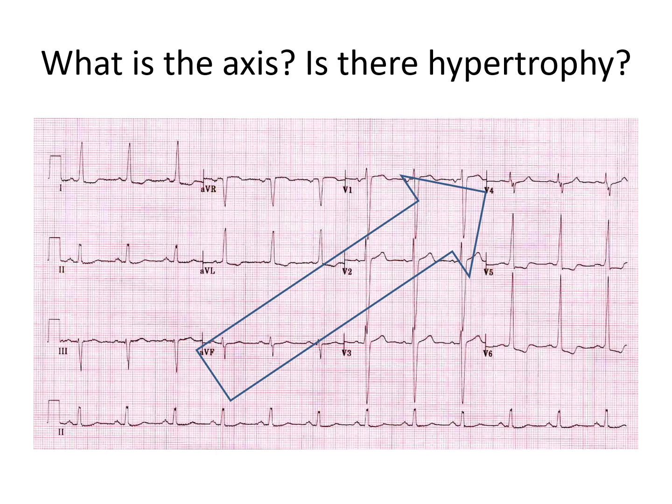Now, let's figure it out just from first principles if there is increased muscle mass on the left. So if there is, we would expect the leads that looked leftwards and upwards and towards the apex to become more strongly positive and taller.